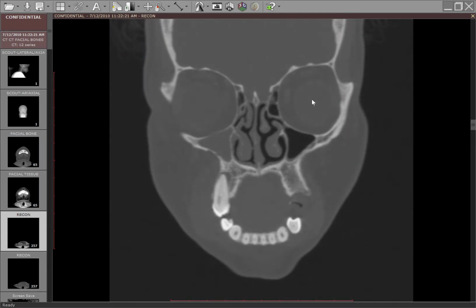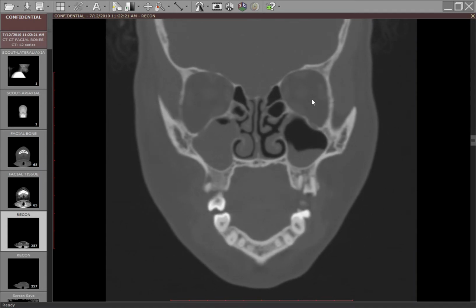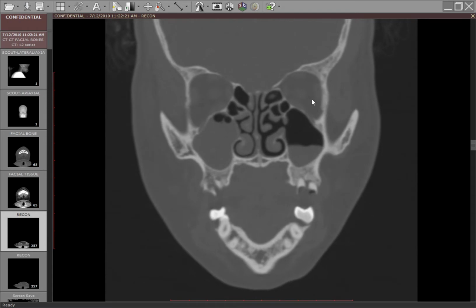Okay, now let's go posteriorly. So let's look at these roots. These little root tips here, they're decayed. There's periapical radiolucencies, but these are draining into the oral cavity. There's no cortical dehiscence here. These wouldn't be causing extraoral facial swelling. These may be abscesses, it may be a lot of decay, but this is not causing the extraoral facial swelling.